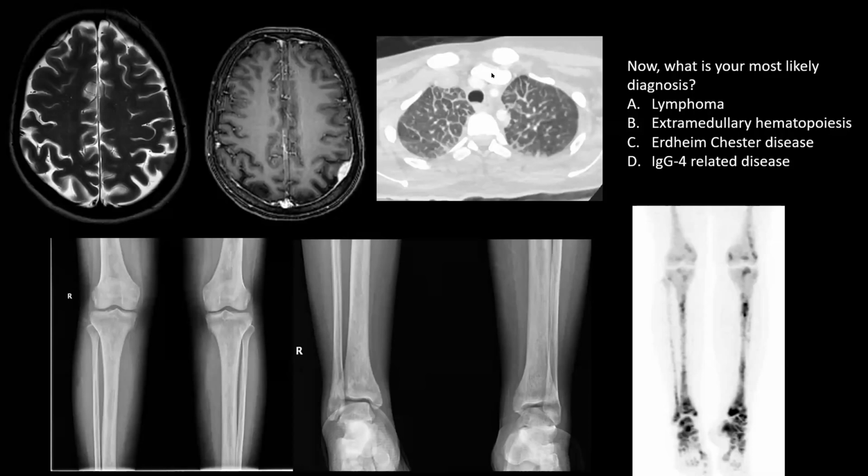So here, the skeletal manifestations are leading us toward Erdheim-Chester disease. These findings are represented by spicules of sclerotic appearance of the bones involving the metaphysis and diaphysis of the long bones, especially here both tibias. It's maybe not that well shown on your screen. However, if you correlate it with the bone scintigraphy images, it shows nicely the hyperactivity in these areas.